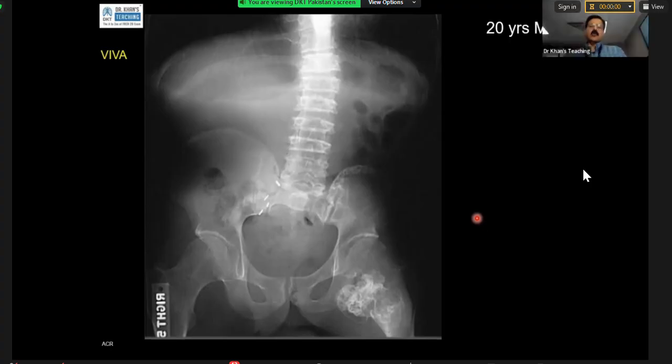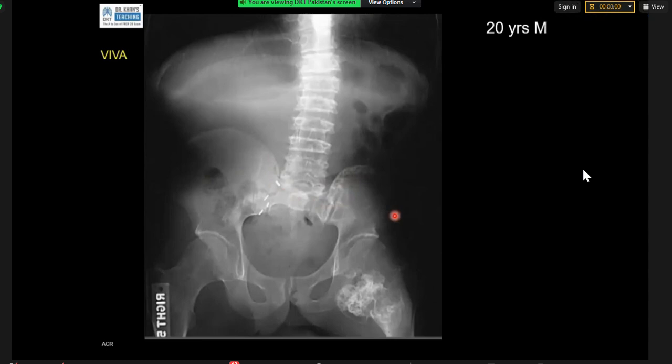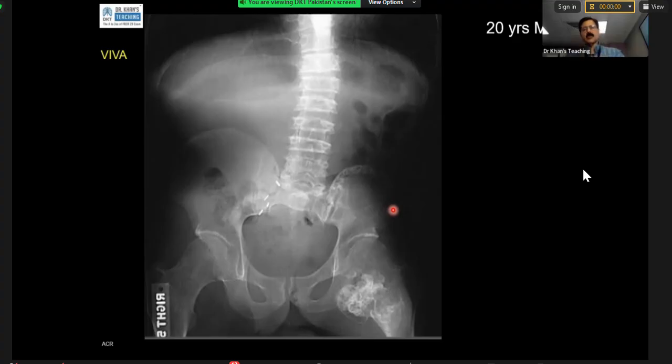Okay, can I stop you? There was no pain or anything. I want you to tell me what is the difference between this iliac bone versus this iliac bone? Yeah, I can see that there is a decrease in the size of the left sacral and iliac bone in comparison with the right side. Because of that, I will see if the patient is a known case of paraplegia or has any spinal tumor before. No, not paraplegia, no spinal tumor.